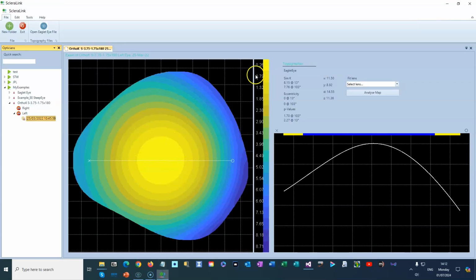We've got this scale here, which has these 17 steps, because that's what we like to do, and they are discrete steps, so we think that you can get a better picture of what different maps are by having this discrete type of scale. So here we go. We can carry out an intense mathematical analysis, and we use that to identify where we think mathematically the sclera begins.